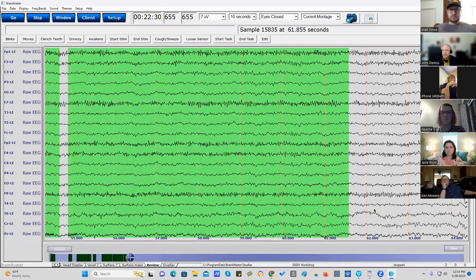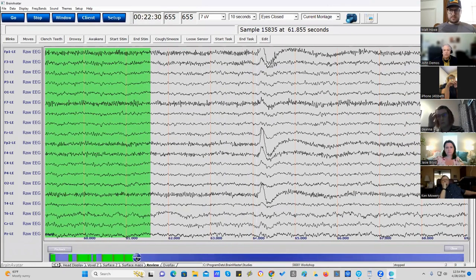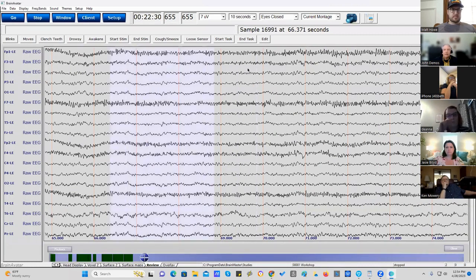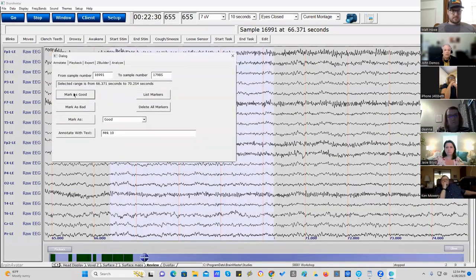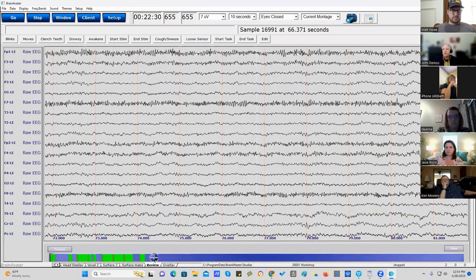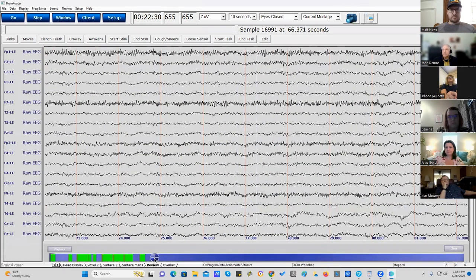It's the same thing with this site here. That's not typical. It's atypical, so I did not select it. And of course, there's an eye movement, and I'm not selecting that. And I'm selecting this. And in my book, in chapter 13, it has some good examples.